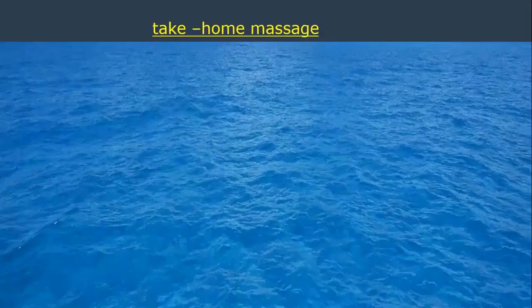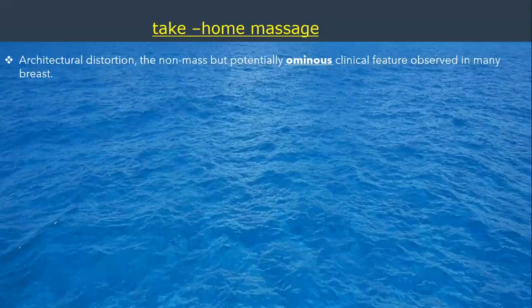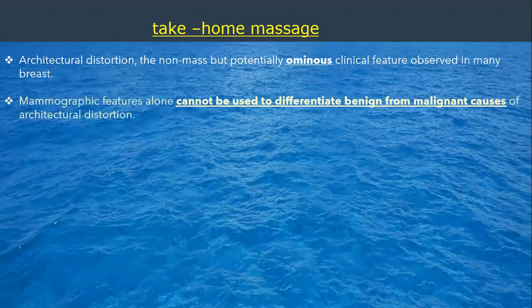So, take-home message: architectural distortion is a non-mass but potentially ominous clinical feature observed in many breasts. Mammographic features cannot be used to differentiate benign from malignant causes of architectural distortion. Causes such as fat necrosis simulate breast cancer very closely, and at the same moment, cancer might simulate radial scar and so forth.